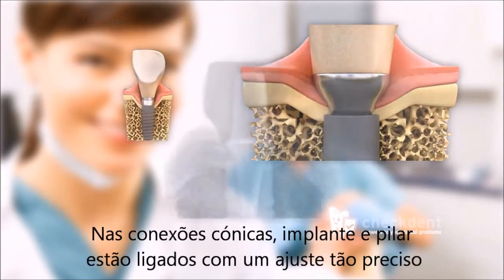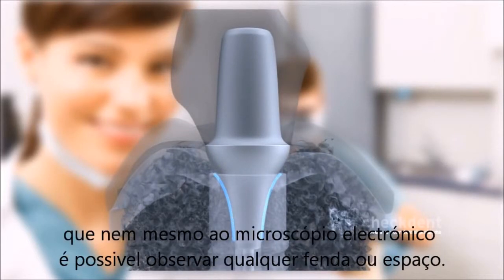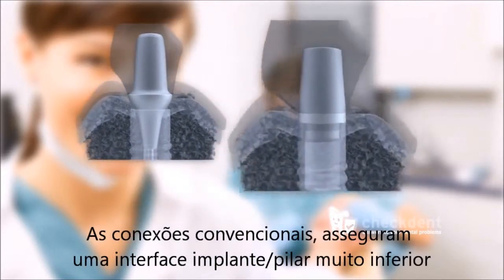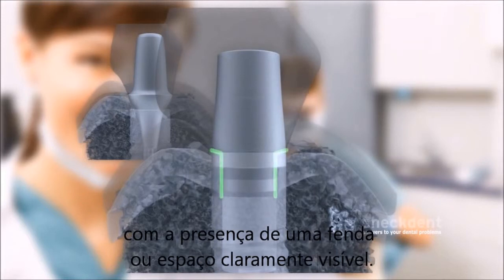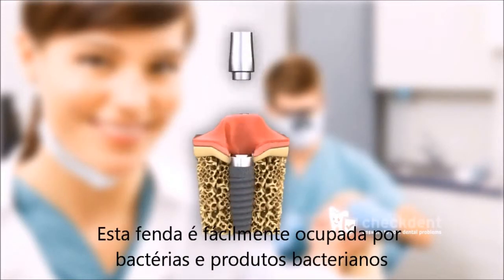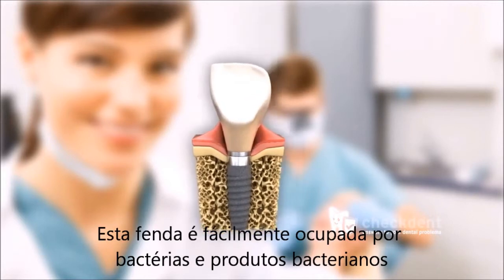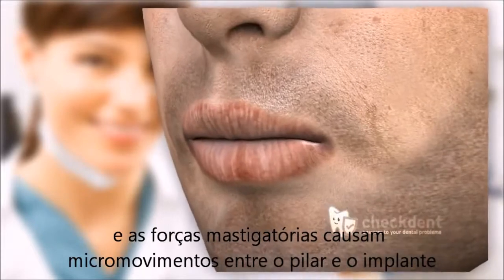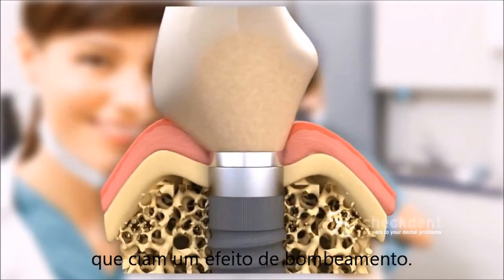With conical connections, abutments and implants are linked so tightly that not even a scanning electron microscope can reveal any spaces or gaps. Conventional plug-in connections provide a less than optimal implant-abutment interface, leading to a clearly visible gap. Immediately after the insertion of the abutment and the crown, this gap gets occupied by bacteria and bacterial products, and chewing motions cause movement between the implant and the abutment, creating a pumping effect with plug-in connections.